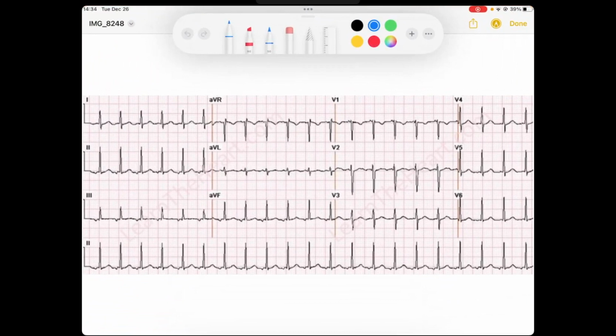So we'll start off by doing what I always love to do with EKGs, and what I like to say is take a look at the forest and look at the trees, and the trees are QRS complexes. And so I look down here at our rhythm strip in lead 2. You see I've got a narrow complex QRS. It's regular. It appears to be quite rapid. If I start, here's one that falls on a solid line. So 300, 150. This is maybe 140 beats per minute. So we know we have a tachycardia.